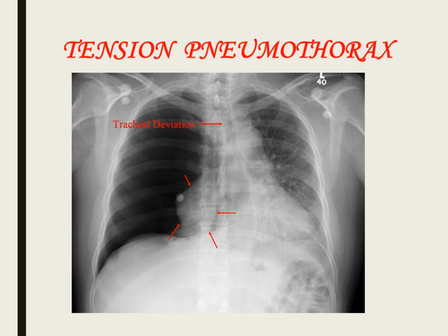It's all just air. Air is dark, right? So that's like a tension pneumothorax, where the right lung is completely collapsed. So the mediastinum shifts, and with the mediastinum shift, you have a trachea shift. So two things shifted, right?